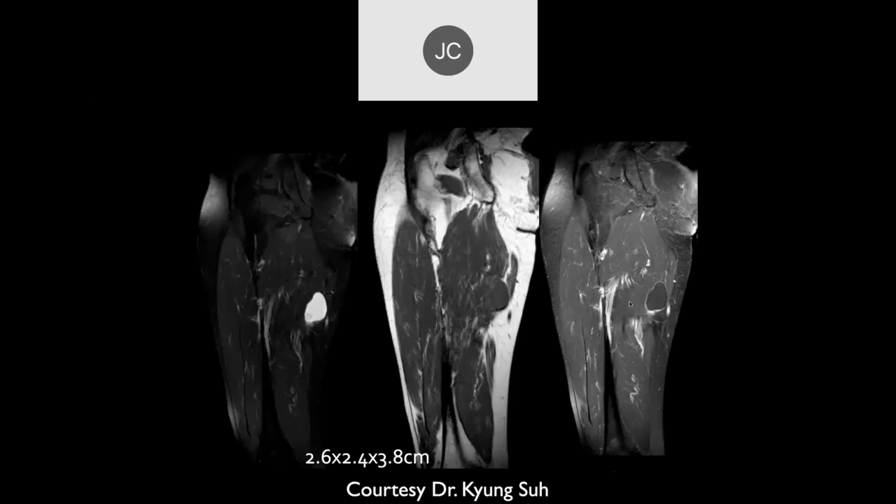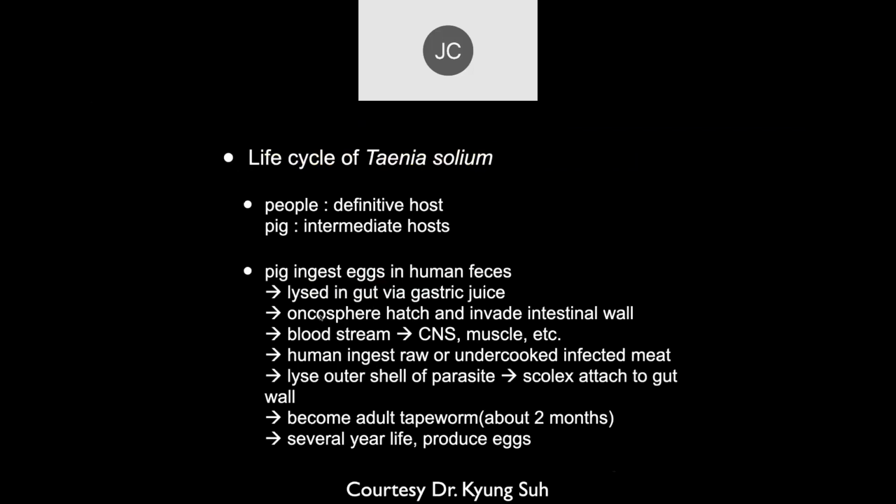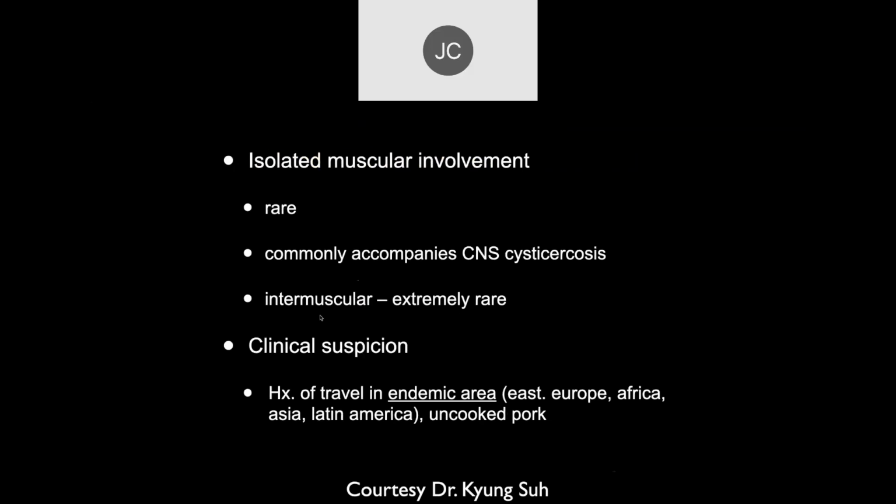Okay. So we have a cystic structure there. I only see a single one, and this is with contrast. There's not a lot of enhancement within it. So they excised it, and this was cysticercosis. Oh, usually with cysticercosis, you'll see multiple lesions. Yeah, so this is atypical. It wouldn't be top of my mind, but this was a case of cysticercosis with just a single cyst. And as we already talked about, it's due to tapeworm, undercooked pork.